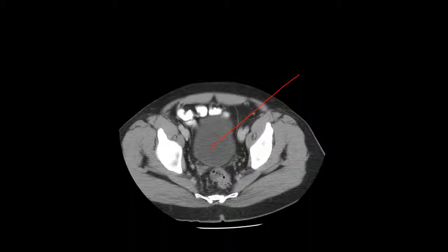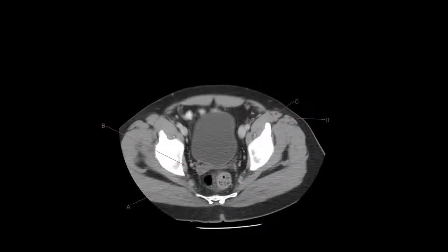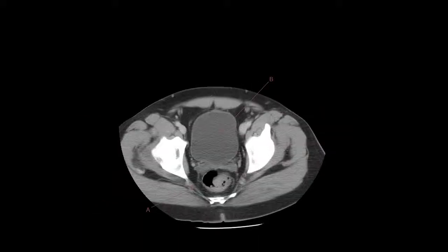Keep an eye on this structure. What do you think this structure might be? We're down in the pelvis for sure. Now this is, again, the rectum, right? All right, so keep following that structure right there. See what you think about that. Again, rectum right there. All right, seminal vesicle, obturator internus, sartorius, tensor fascia latae again. Not structures I'm worried about.